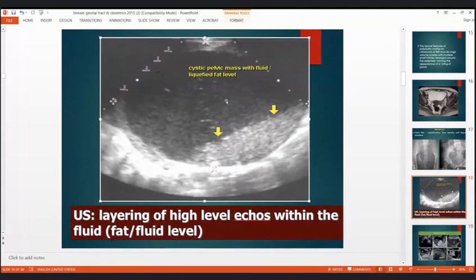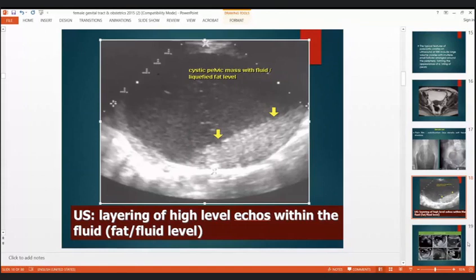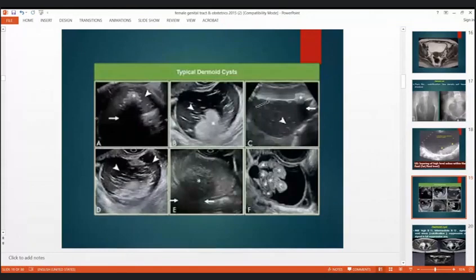By complex, I mean that the cystic lesion will have areas of solid content, then will have areas of fluid content, we have areas of wall thickening. So it has apparently like cystic and solid composition. On ultrasound, various appearances can be seen, such as layering of fluid in this example of dermoid cyst, and various other ultrasound images. It can be completely echogenic.